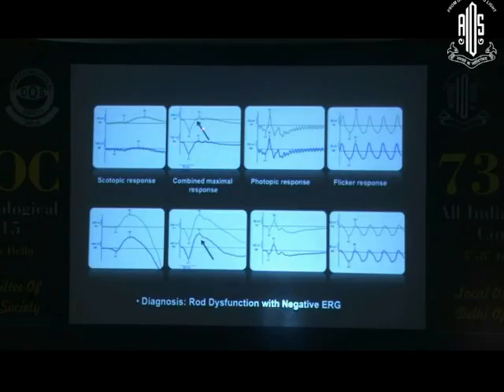So again, a classic electronegative ERG on the combined response. So it's in the combined response that you typically find this electronegativity. So you've got to look for those in the combined response.